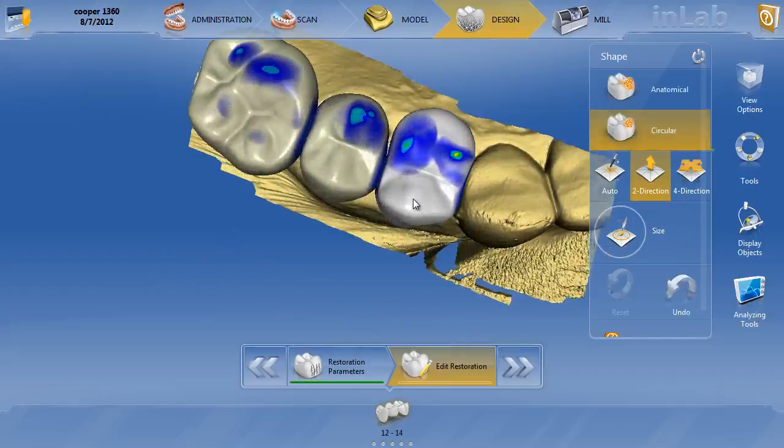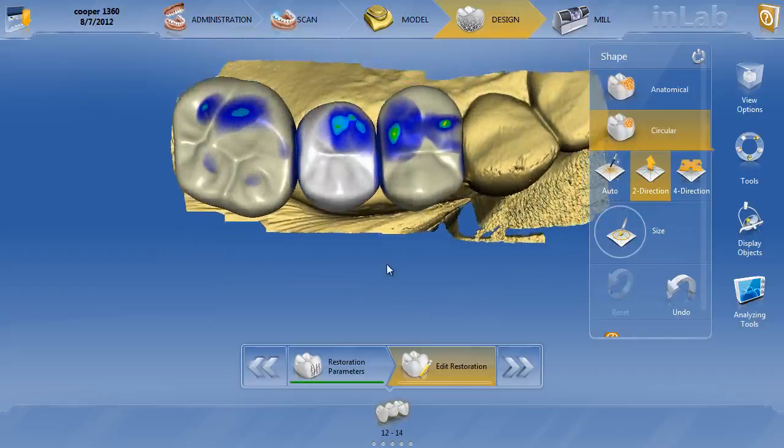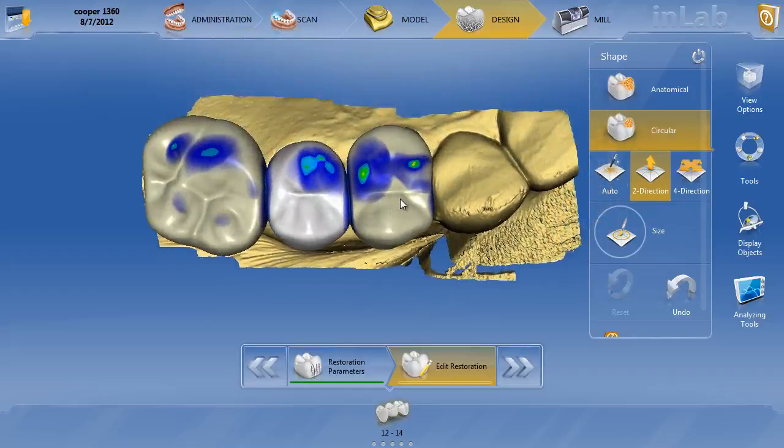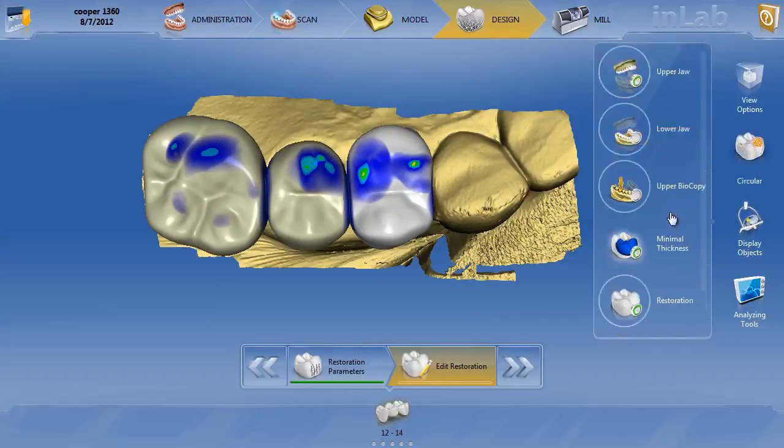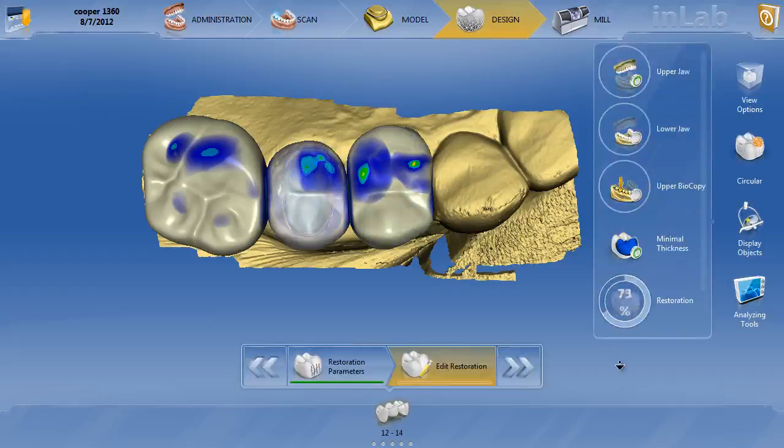And you guys know how to design teeth, but the main thing we have to be sure of is the connector. Okay, the other thing I would look at here is the mesial-distal dimension, excuse me. If we look at tooth number 12, we can go ahead and put that transparent. That pretty much is where it has to be. However, number 13 is a little bit smaller, but you have room where you're probably going to be able to make this a little bit bigger.